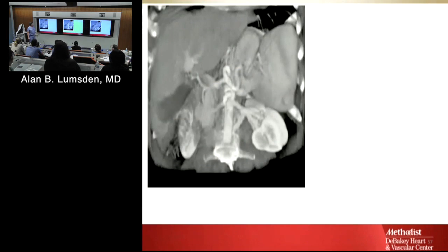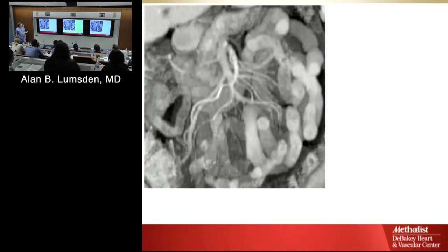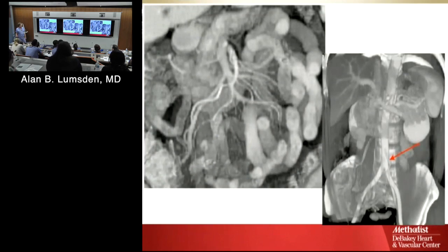Okay? This is kind of what it looks like in an MR. So what artery is that? Just starting to recognize patterns. Okay, SMA, the SMA pattern. What are all these things in the background? And what is that thing? We already looked at it on one of the others. It's an SMV. Okay, a lot of information on there. SMV branches. Okay, inferior mesenteric artery.